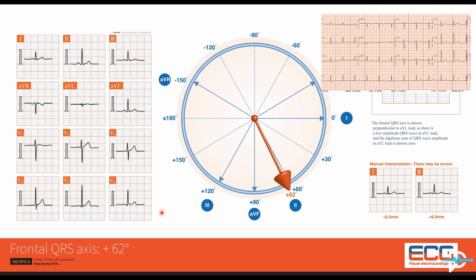And it makes sense because as you work your way around the body with those lead placements, you should have the vectors slowly transitioning to a different ultimate direction.